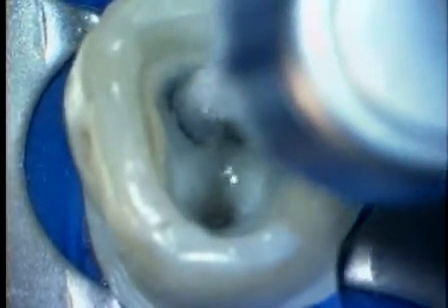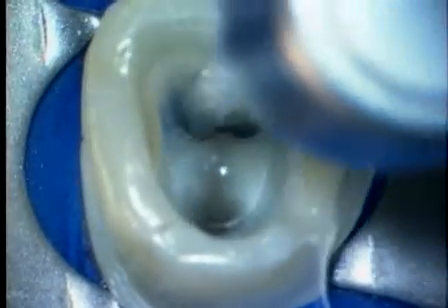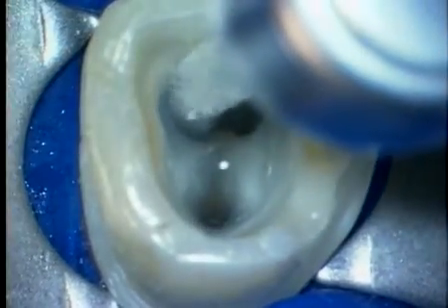Currently, tapered microbrushes are being field tested. Evidence supports that a microbrush can produce clean root canal walls with open dentinal tubules. The microbrushes will be on the market soon.